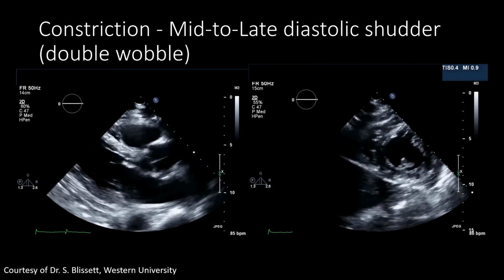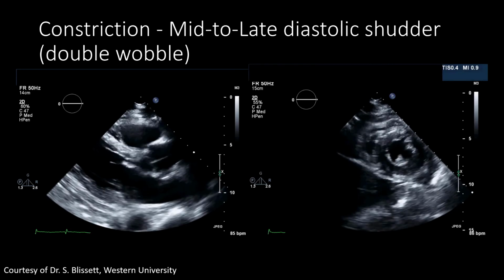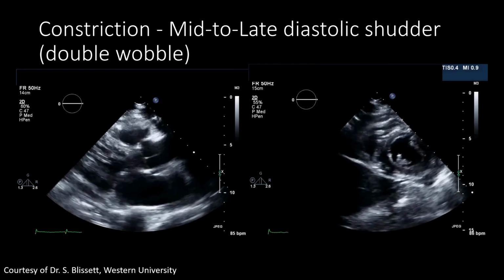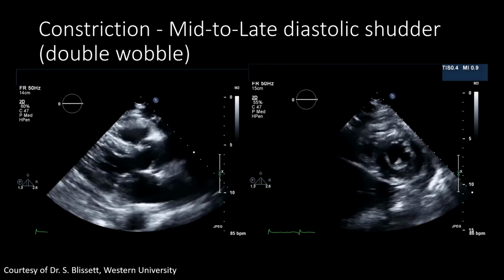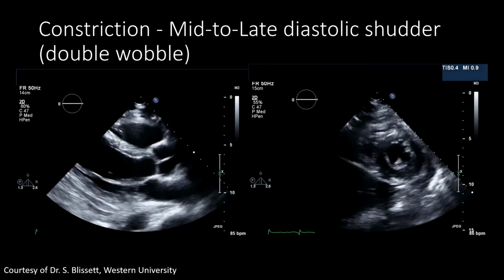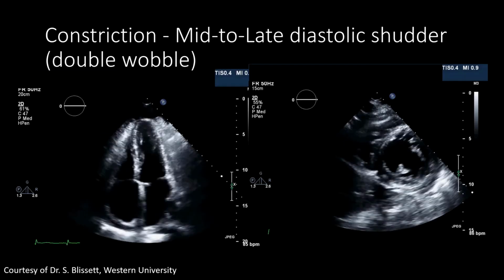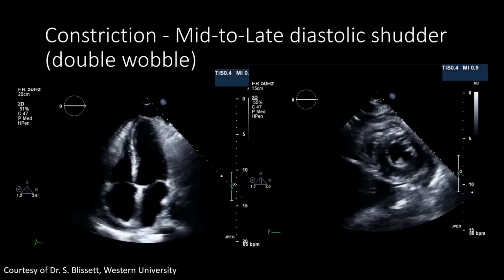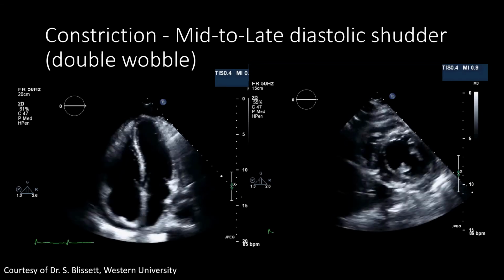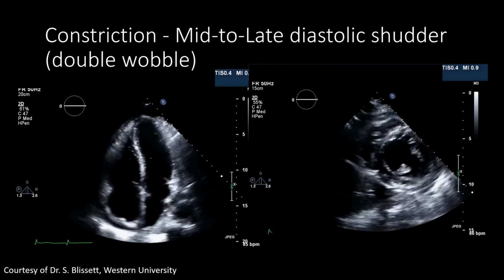The most impressive finding, however, is the sudden excessive septal shift, representing sudden halted filling during inspiration. You will see that the septum rapidly and excessively shifts from the RV towards the LV. This is typical constrictive pattern. Notice how strong the septum bounces back in the apical 4-chamber view? That is pretty obvious constrictive pericarditis. Of course, it is not always that evident.